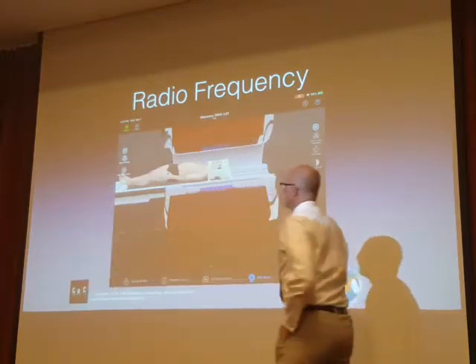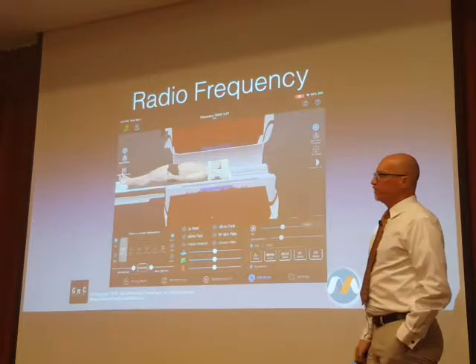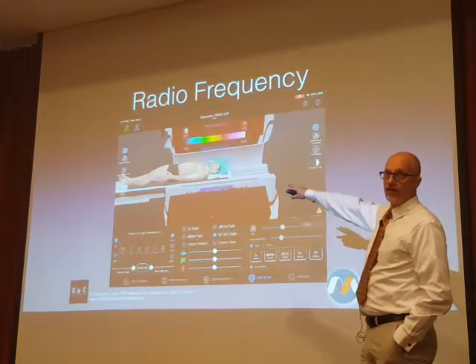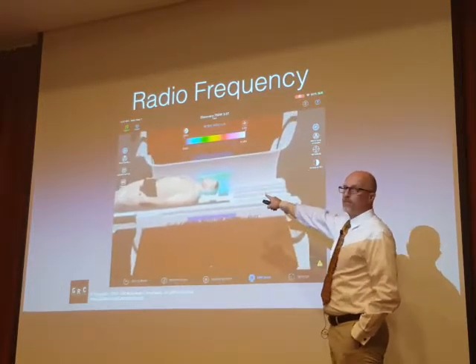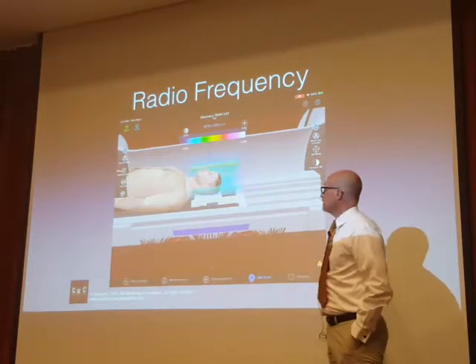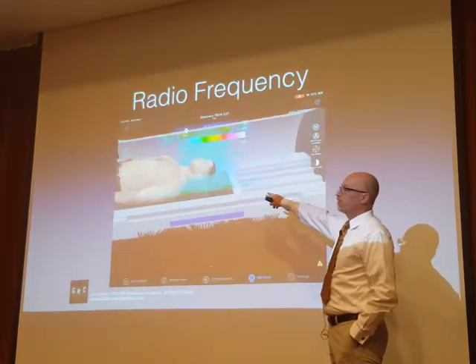So here we're going to take a look at radiofrequency transmission. We're actually going to make a comparison between using a transmit-receive head coil, and we're going to look at the same study with a body coil. So here we're looking at radiofrequency power using a transmit-receive head coil. This is the radiofrequency transmit power using the body coil.